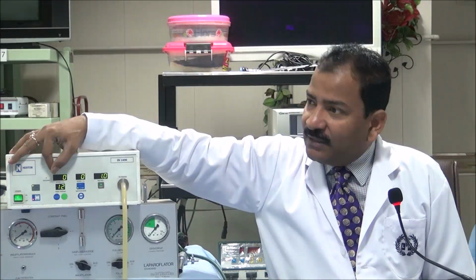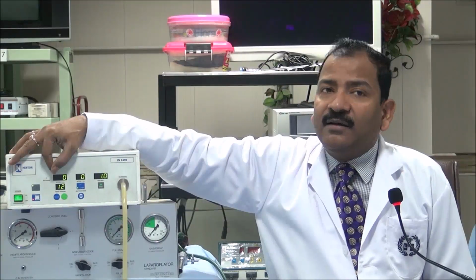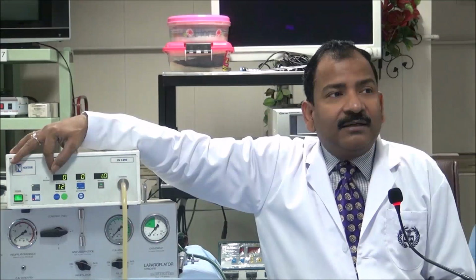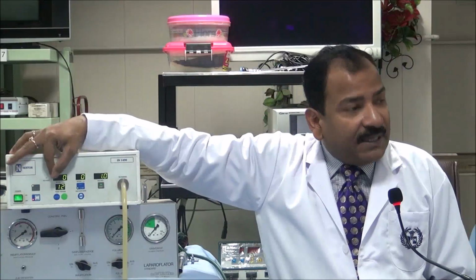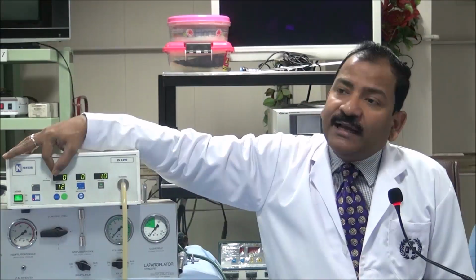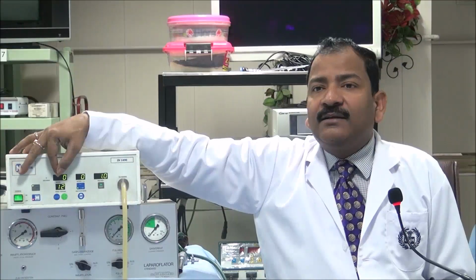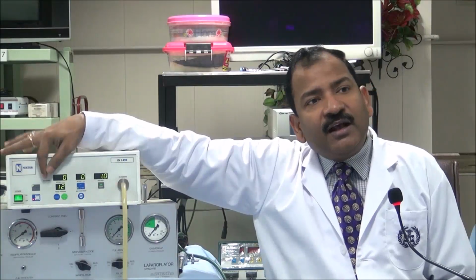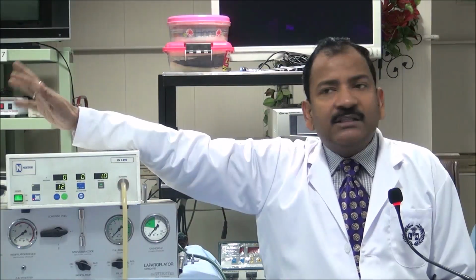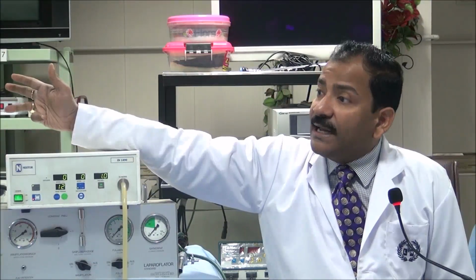So I should immediately know, and I should take the Veress needle out and put it again. If it is blocked, immediately it rises more than the preset pressure, and it starts giving an alarm. Is that clear? Even in the bowel, you will get all over dullness, one-sided tympanic and unilateral distension. If it is in the vena cava, then it will be dangerous. Your patient's tachycardia also increases due to bleeding, and the pressure is not rising.